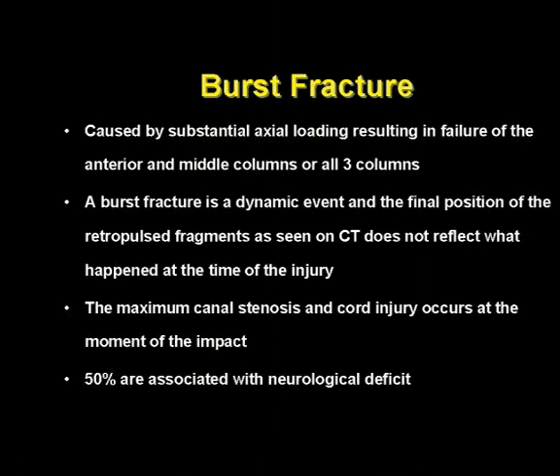The burst injury is a much more serious injury. It's caused by substantial loading. And what you see on CT, all these patients get CT because it's a serious injury, and I'll show you why in a minute. What you see on CT, the displacement of the retropulsed fragments, does not really reflect what happened during the injury. The maximum impact actually happened during the injury, and the injury to the cord occurred at that point. So what we see really minimizes what happened during the injury.